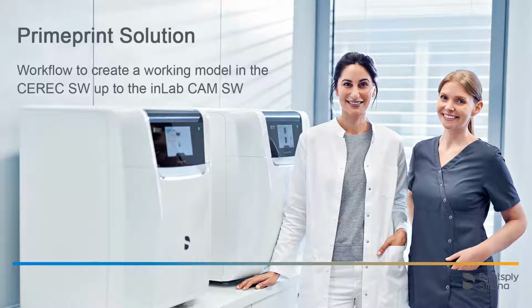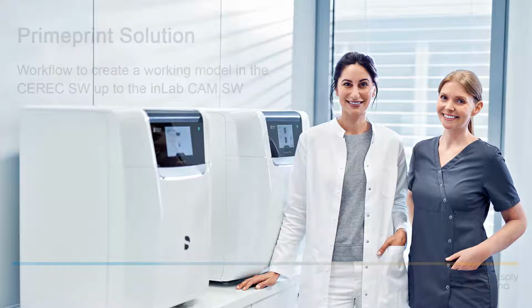Welcome to this video tutorial on the topic of Primeprint Solution. In this video, we will demonstrate the workflow of creating a working model. We will guide you through the CEREC software and the InLab Model app up to the InLab CAM software.